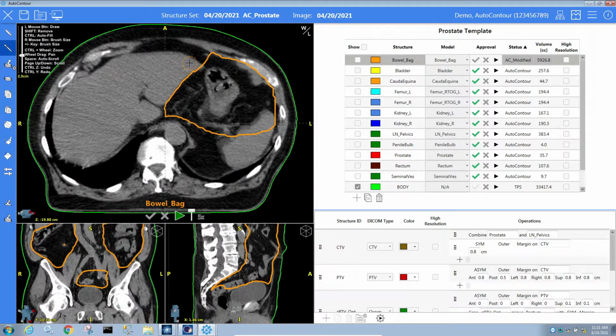and now I'm going to use this recent edit interpolation tool to help me contour and make these edits even faster. So what this allows me to do is make an edit every couple of slices and then go back, interpolate, and overwrite the contours in between. So let's take a look at how this works.